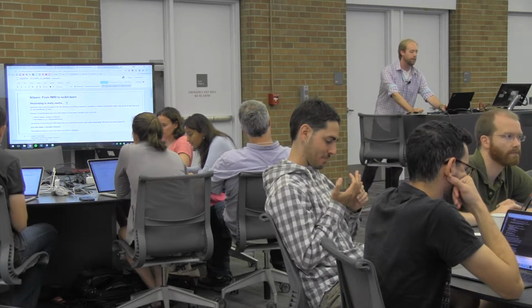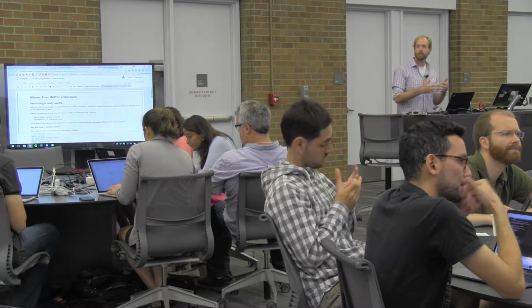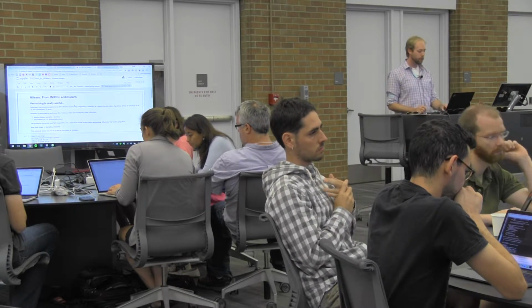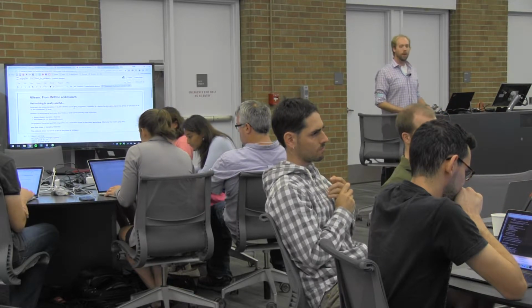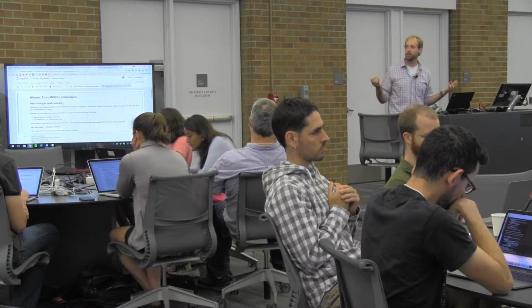Okay. So the next thing that I want to quickly talk about is, all right, so we've figured out how to read in this neuroimaging data into Python. We have it in memory as this nifti object. But how do we actually connect that with something like Scikit-Learn so that we can do some cool machine learning with that data? And to talk about that, I want to cover a really important topic in the field of machine learning, and that's something that's often referred to as vectorizing.